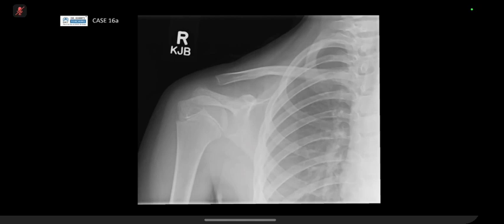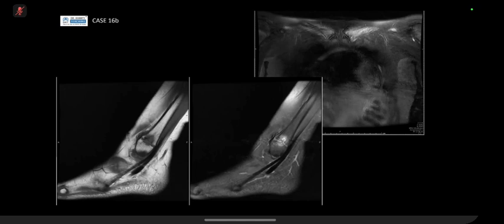Does the patient have anything else like rheumatoid arthritis or a known case of anything? Nope. She tells you she's got right-sided pain. Now she also has left-sided pain. So I've got more pictures. Yes, please. Okay. All right. This is an MRI showing bone marrow edema at both medial aspects of the clavicle with soft tissue edema surrounding it.